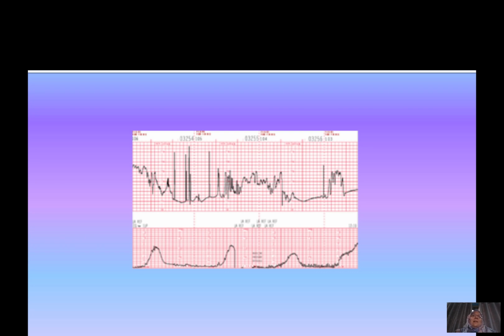So this is not an acceleration. The last little mountain you see in this CTG is not an acceleration. It's actually the recovery of a deceleration, but it goes down quickly again. So this baby is severely compromised. It cannot properly recover from a period of bradycardia, and it really needs urgent help here to be delivered and not become more unwell.